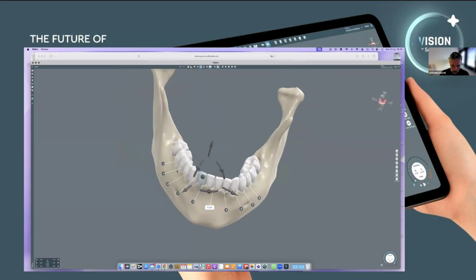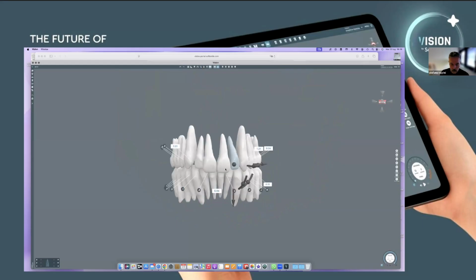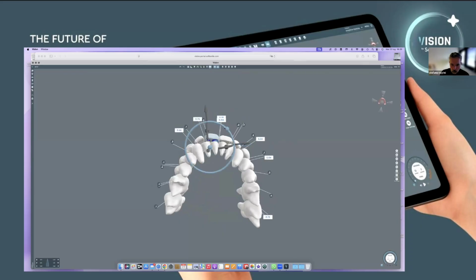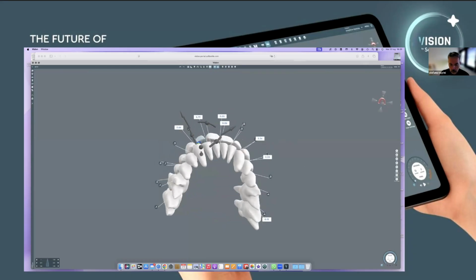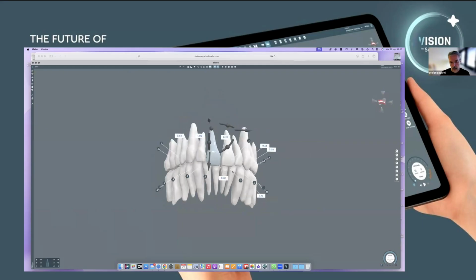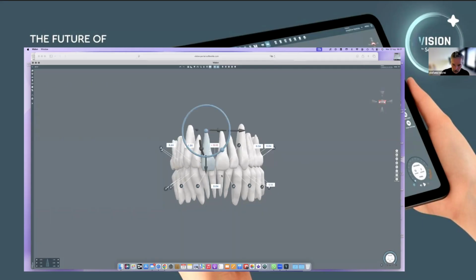Okay, just to check the bone. When we move the tooth like this, to close the space, we can increase the overbite and overjet a little bit, because most of the time it is not body movement in intrusion or extrusion, but a combination of movements.